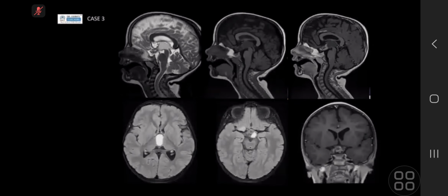So in comparing, there is no evidence of hydrocephalus. So I'm worried about this mass in the suprasellar region anteriorly, as well as extending to the third ventricle. So a suprasellar region mass in the center, in a female, it could be a germ cell tumor. In this region also craniopharyngioma, as well as Rathke cleft cyst. However, this is a cystic solid lesion.